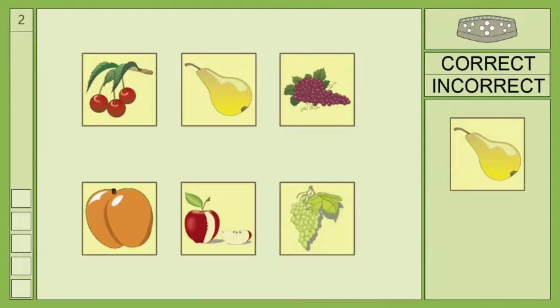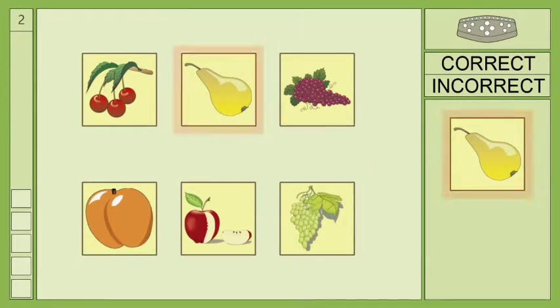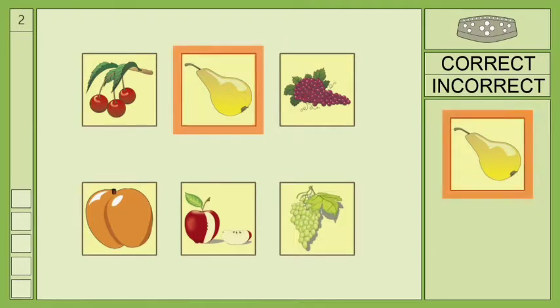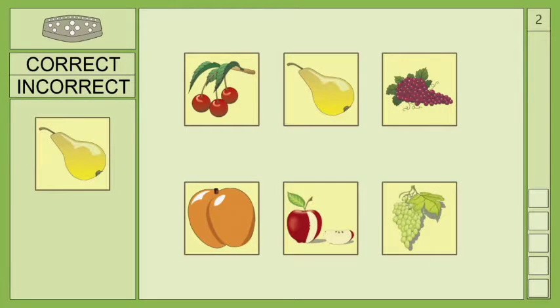In this module, the task is to find the correct object in a set of presented objects in a matrix. The reference object is shown at the side of the screen. Only one object in the matrix is identical to it. Depending on the impairment, it is possible to switch the position of the matrix and the reference object.